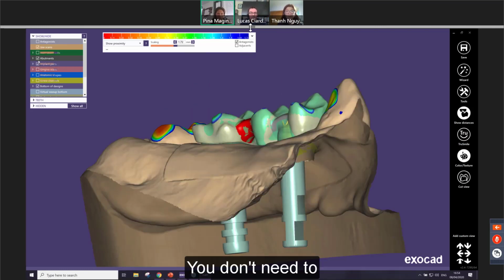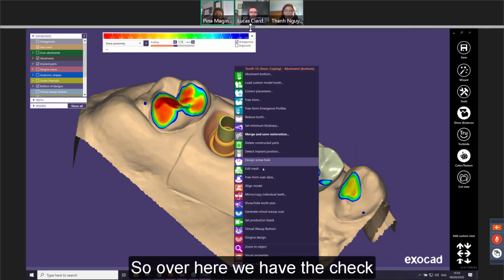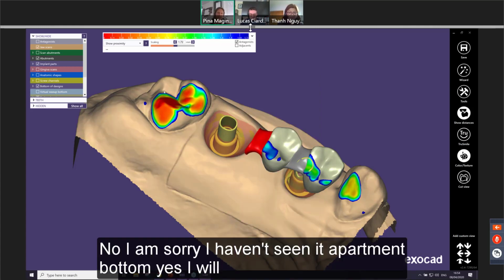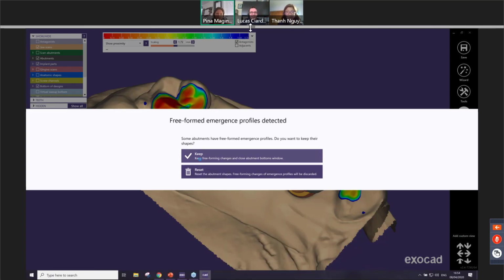This one we don't need. This one also I will hide. So over here we have, let me check. No, here, sorry, I haven't seen it. Abutment bottom. Yes, I will, no, sorry.